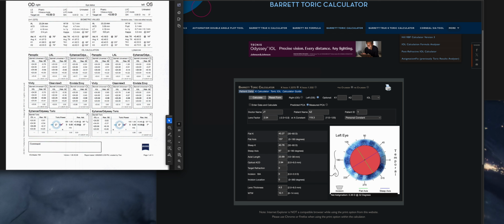And you can tell what the formulas are using by looking at this little box here. So right now this is a virgin cornea. We're using Ks. It's more accurate. But another patient may have had LASIK, and so you'll see it'll say LVC LASIK, and then LVC mode myopic or whatever. And then down here you'll see TK, and that's going to produce a more accurate result. Okay, so I'm probably presenting this one just to show you the difference between the 500 and the 700. Oh, and okay, so we're doing a virgin cornea.